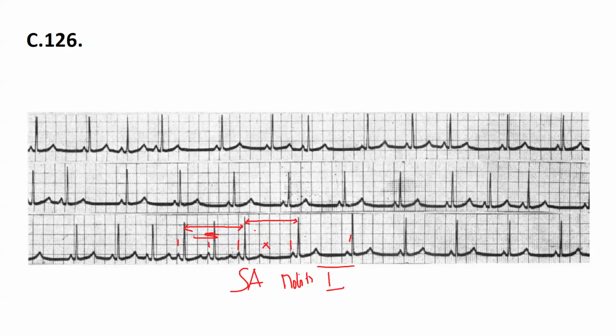Let's move on. Sorry, just one quick question. Can you remind me how you can tell if it's a sinus arrest or an SA block? Basically, you cannot tell based on the 12-lead ECG, because you do not have any clue whether the sinus was activated or not. If you have an esophageal ECG or intracardiac ECG, you could see it. Okay, all right, thank you.